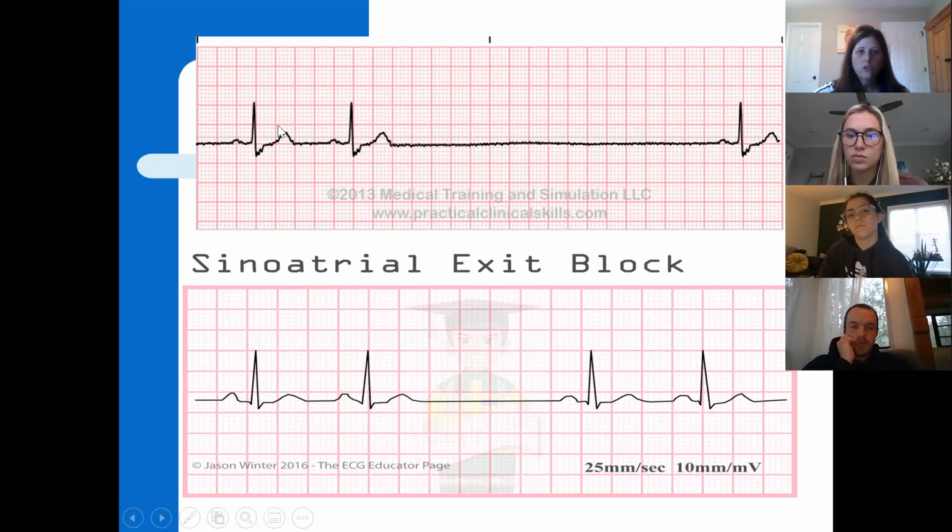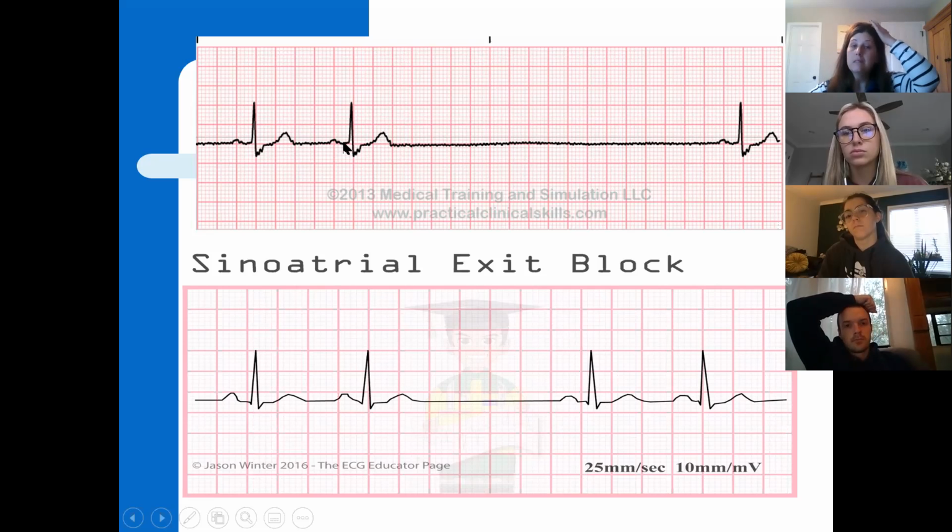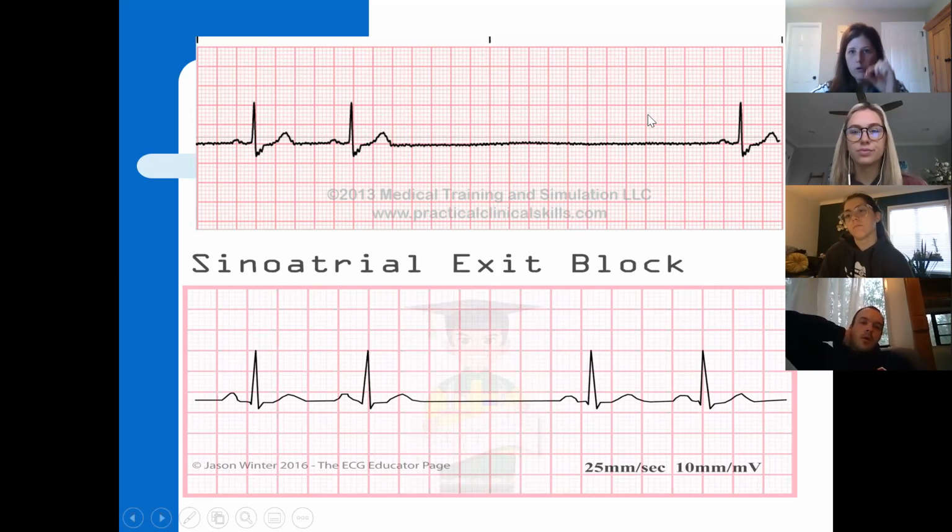So 1, 2, 3, 4, 5, 6, 7, 8-ish, 8.5-ish, but still we counted 20, and this is roughly, let's just say 6, I don't know, I'm going to say 8. So twice 8 would be 16, and this is greater than that. We counted that out was roughly 20 without doing it real precise. So it's greater than twice the 2 previous cycles.